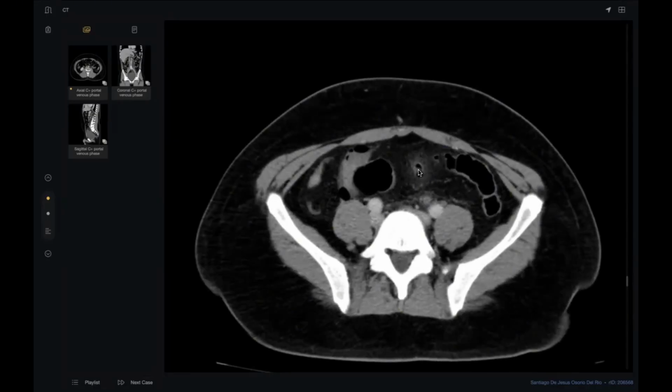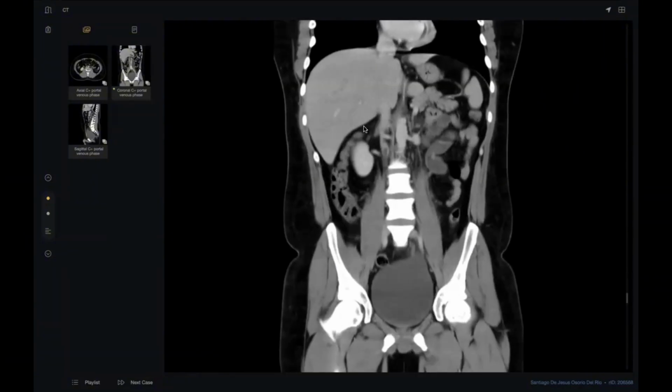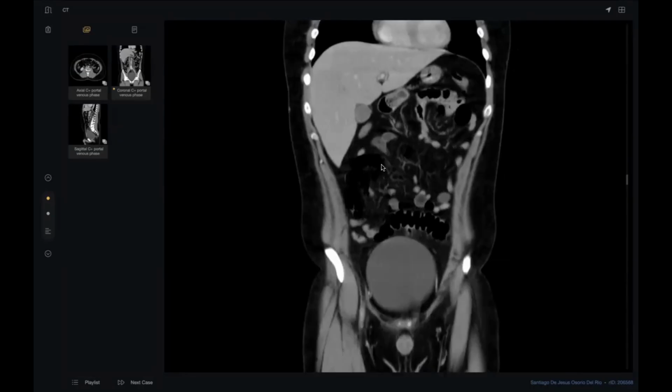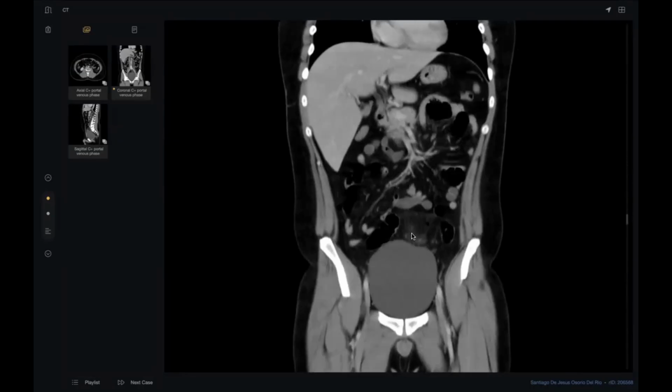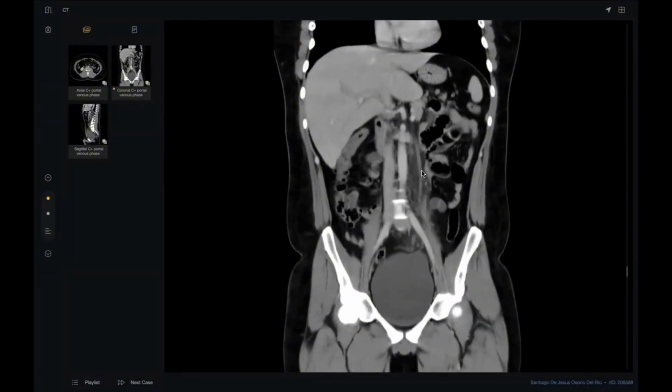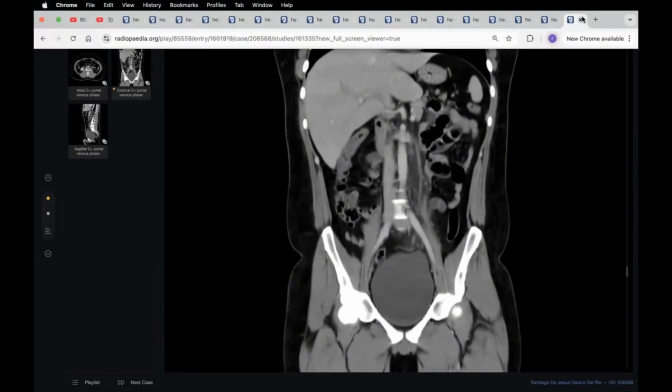See, this is outside the colon, by the way. Look here. See, air loculi outside the colon, and smudging of the vessel. Plus, this vessel is completely thrombosed. Thank you, doctor. You picked up this mild type of diverticulitis. You did very well. Thank you so much, sir. Next candidate.